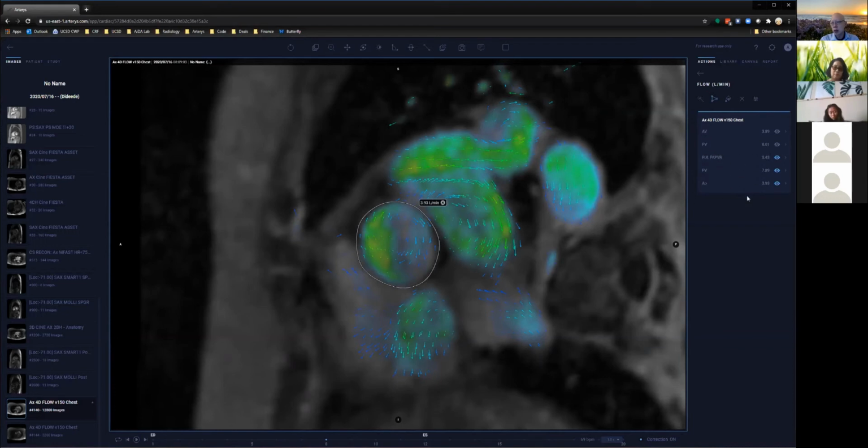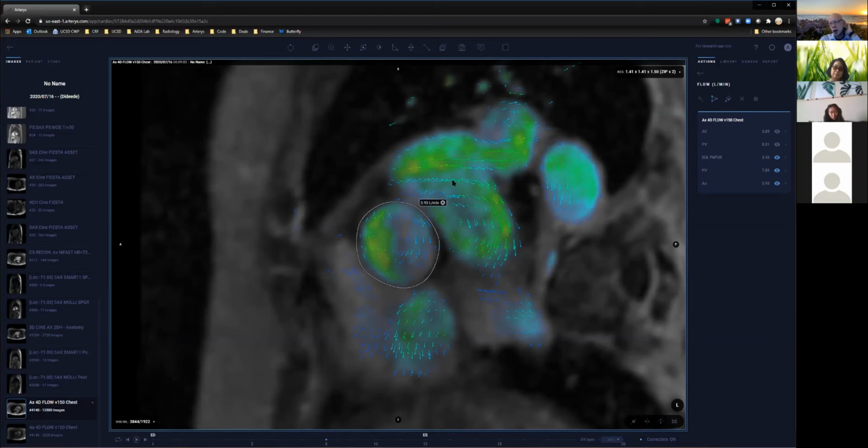You can see what the sort of error bar is on these flow measurements. And that's a really good and important thing to optimize when you're getting started with 4D flow, is not to try to over accelerate it so that your scan times are like 2 minutes or something, because while you can do that, in my opinion, the quantitative measurements are the reason why people come to get cardiac MRI for congenital heart disease.